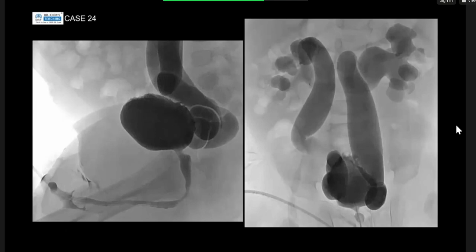Okay, does the bladder look abnormal? Yeah, that looks abnormal. That looks like an irregular trabeculated appearance with small. So you have to remember that this is a dynamic study. If you look on the lateral where the bladder's relatively well distended, what do you think there? So again, this can be an isolated abnormality of bilateral vesico-ureteric reflux.